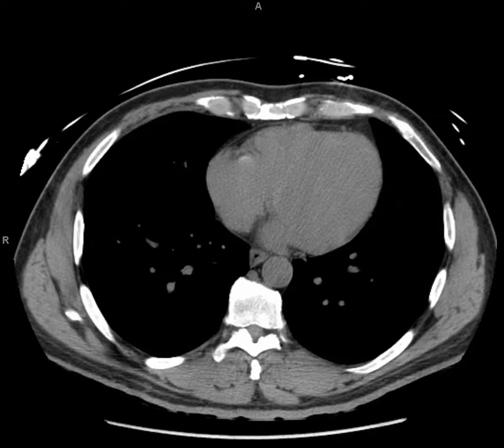So when we're talking about cross-sectional imaging and CT scans, this is a CT of the abdomen and pelvis. When you do an abdomen and pelvis CT, I typically do abdomen and pelvis together unless there's a reason you're doing just the abdomen, because there is really no good cutoff between the abdomen and the pelvis. The iliac crest is the radiographic cutoff that they use, but the organs cross, right? Your intestines go all over, the kidneys cross that barrier.